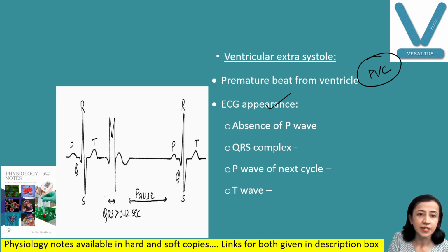You can see here no P wave is there. This is T. Okay, you can draw this kind of diagram also, this self-drawn diagram. You can also make a practice of making this kind of diagrams.